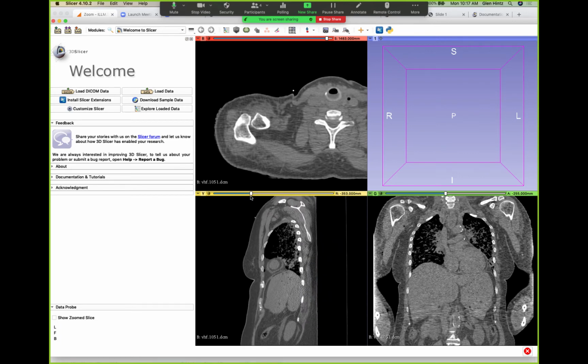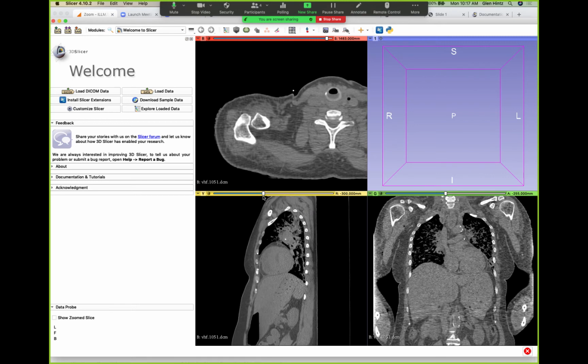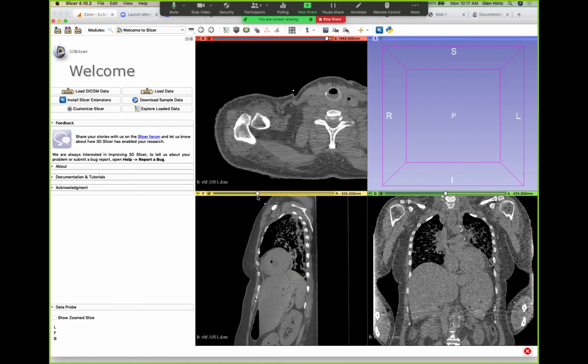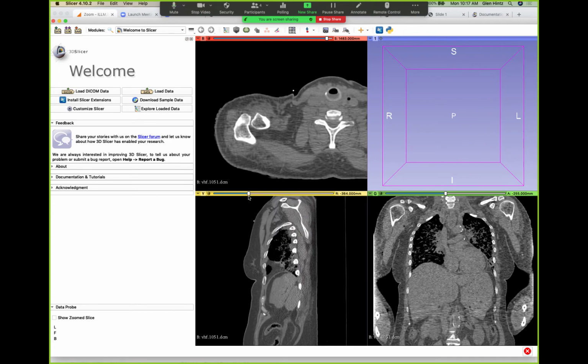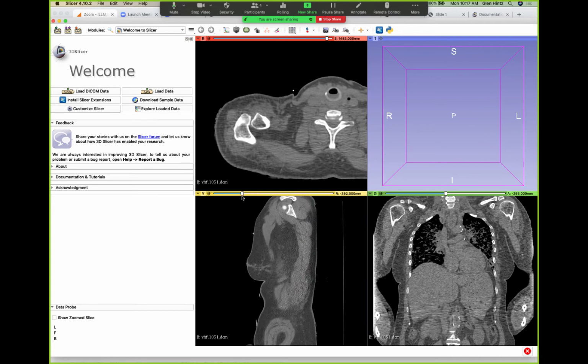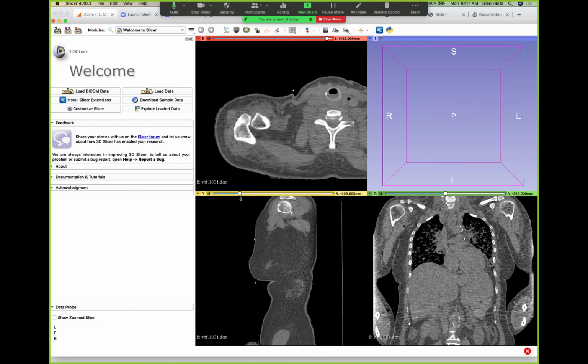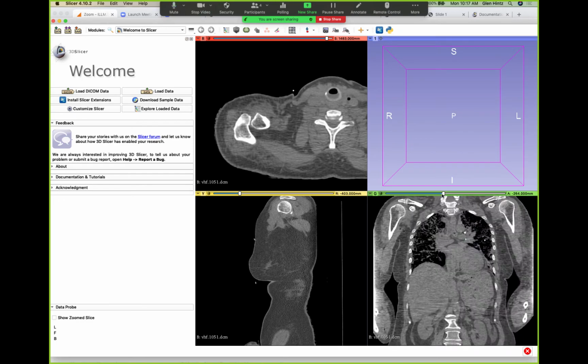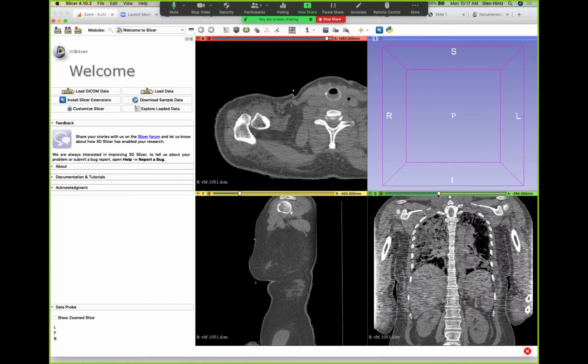And you can see, so here you're in the midline. You're not seeing the scapula. As you come laterally, you can start to see the scapula develop. If you go too far, you'll start to see the head of the humerus, right? And then the same thing, obviously, with your coronal section. So right about there, you're starting to see.